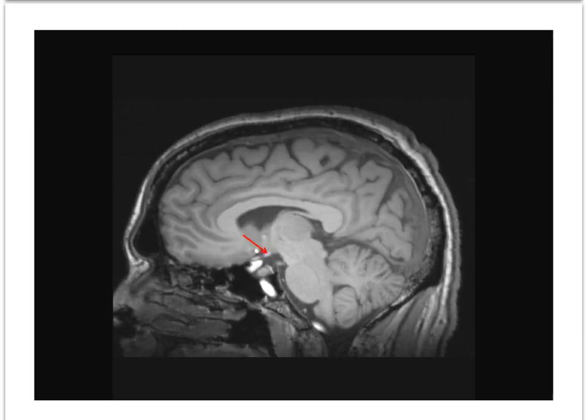Moving a little more laterally, we can again trace the optic tract and again see the oculomotor nerve, the third nerve, heading from the interpeduncular cistern toward the cavernous sinus. And we can again see the body of the fornix. This arrow is the medial aspect of the head of caudate nucleus coming into view. This arrow indicates the superior cerebellar peduncle.